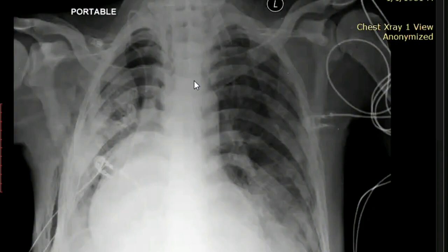And the endotracheal tube, the lower end is not very well visible, but it's definitely above the carina. I think it ends somewhere here. So how much? I think 2 to 3 centimeters above the carina. Yeah? 5 centimeters above. I think I remember 3, but for a portable film, maybe 5. But practically, when I look at the carina here and the tube at the level of the clavicles, then I say it's normal.